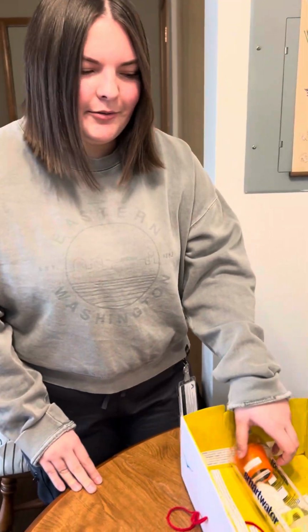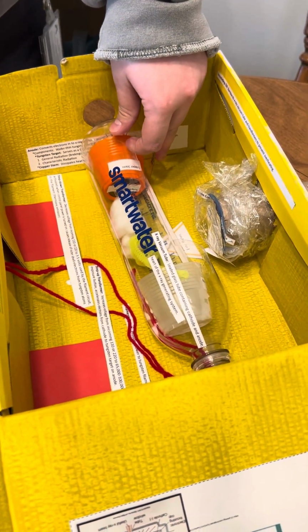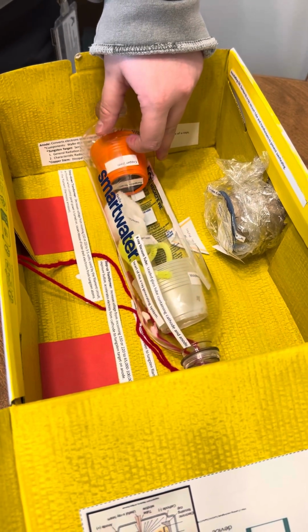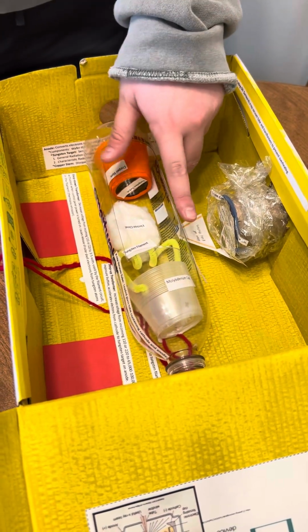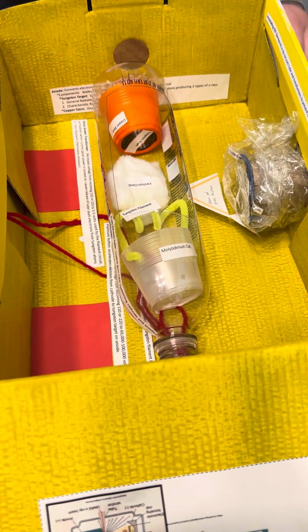My name's Courtney, and I will be introducing the X-ray vacuum tube. So this is our vacuum tube. It is a leaded glass tube that contains the cathode and the anode. This is the heart of the X-ray generating system. On this end, we have the cathode, which supplies electrons needed to generate X-rays. They have a negative charge.